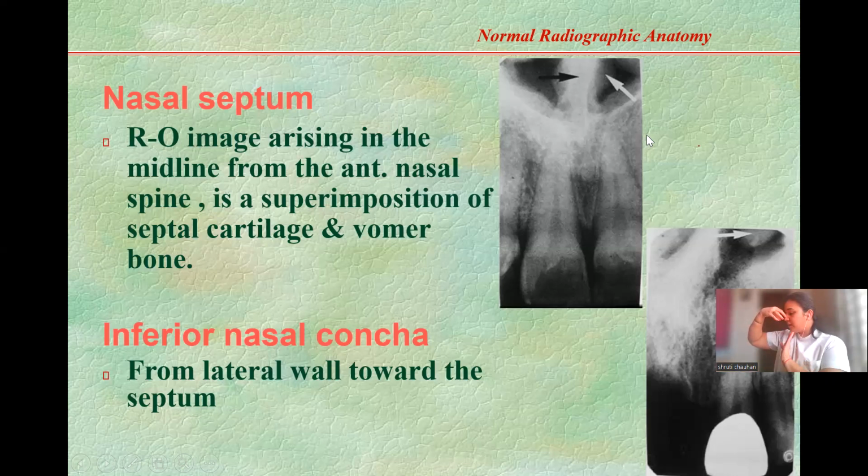Now, when I see my teeth on the radiograph, this X-ray is also penetrating through my nose, and some X-rays are penetrating directly above my lips. So the X-rays which are going through my nose, how is that going to appear? Again, answer in terms of extra or less.